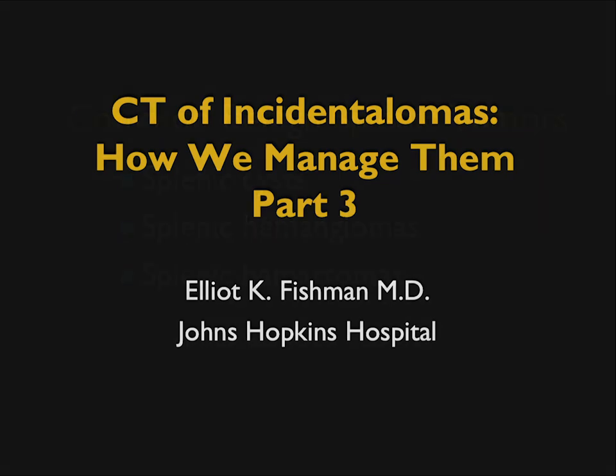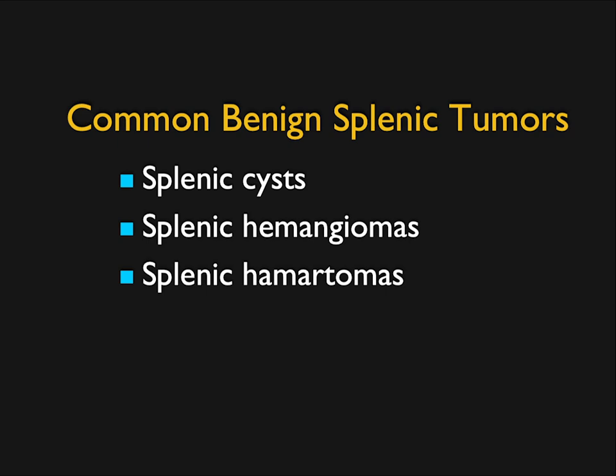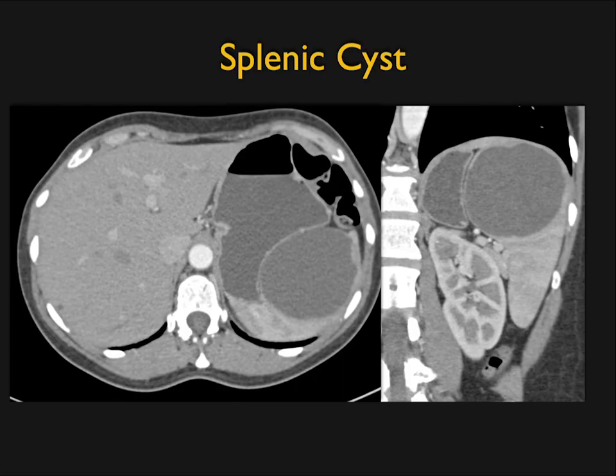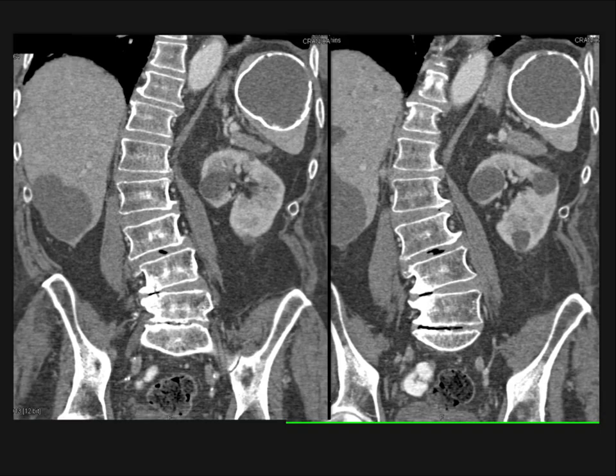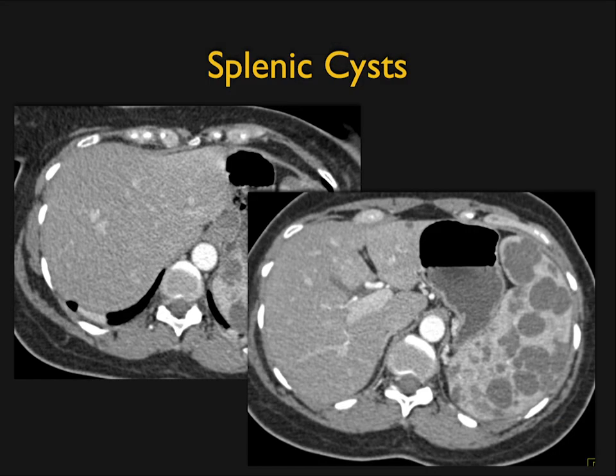We were talking about the spleen before, and I mentioned how splenic lesions are very common. Whether it's a cyst like this, or maybe an old hematoma with calcification, not a problem, or multiple splenic cysts. Sometimes multiple splenic cysts can be challenging, but they are well-defined, water density. We see them more commonly in certain conditions, but that's splenic cysts.